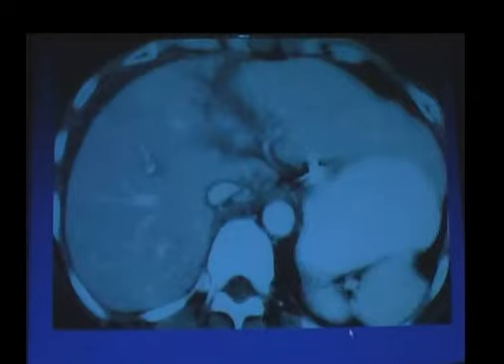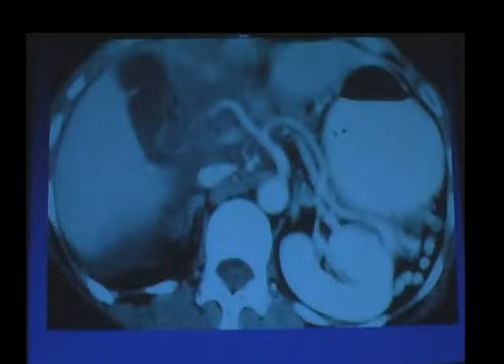And this is an unfortunate woman who came in after a motor vehicle accident. She was having tremendous amounts of abdominal pain and was becoming a little bit hypotensive, but they really wanted her to be scanned. When we put her in the scanner, you can see that there are multiple hepatic lacerations. When we scan more inferiorly, you can see this abrupt cutoff of the hepatic artery due to a transection. You can see the large amount of hemoperitoneum in the right upper quadrant. As we scanned even more inferiorly, you can see this active extravasation from the portal vein, with extravasation of contrast material here from both the artery and the vein.